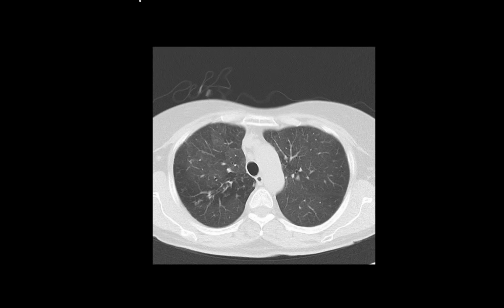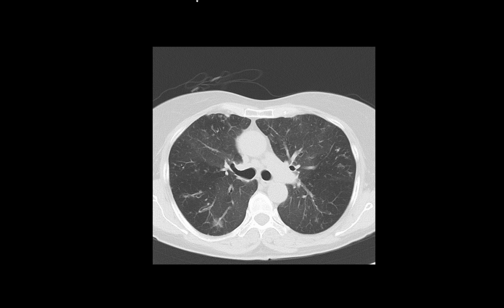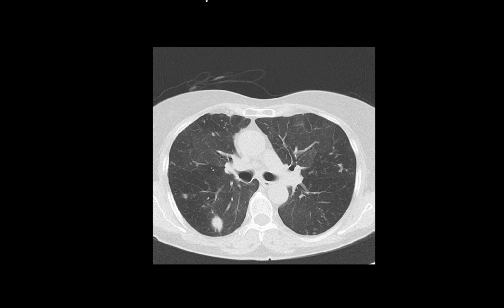In my experience, the earliest manifestations of MAC are not in the middle lobe and lingular where we see it when it's taken hold, but in this axillary aspect of the right upper lobe. So this is the classic location where I've seen the earliest findings, usually small airway shadows, little tree-and-bud things in this region here. So this woman isn't showing that characteristic distribution, but I've seen that so many times in the earliest manifestations of MAC, is that it likes to be near the right axilla.